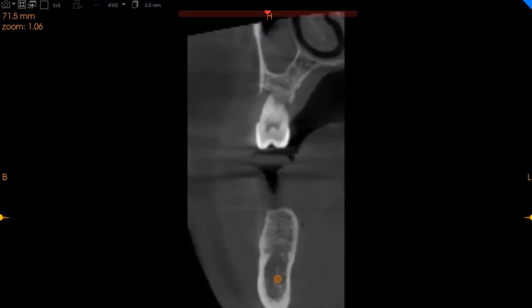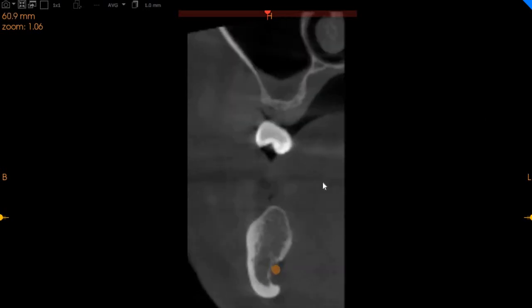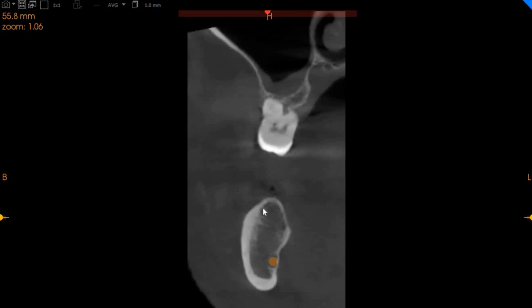The lower right first molar region, again we've got a D3 to D4 quality bone, but this can sustain an implant. The cancellous bone is very significantly radiolucent, but the first molar and the second molar region implants can be placed, as we have measured the ridge, and the ridge is good and supportive of dental implants.